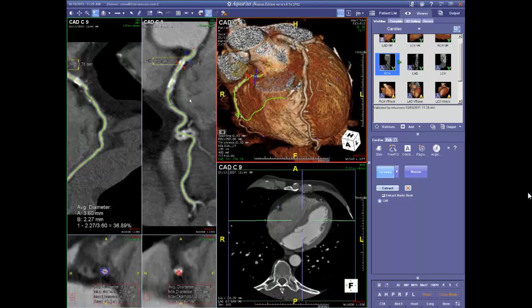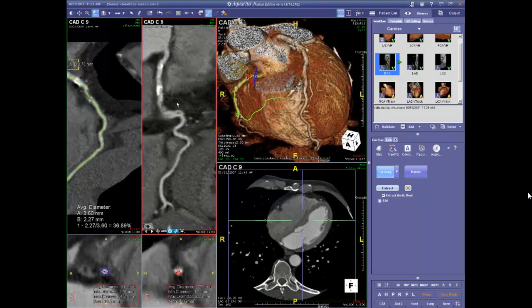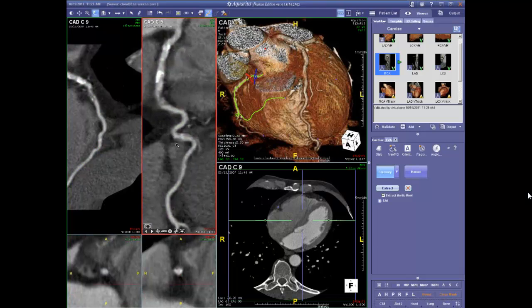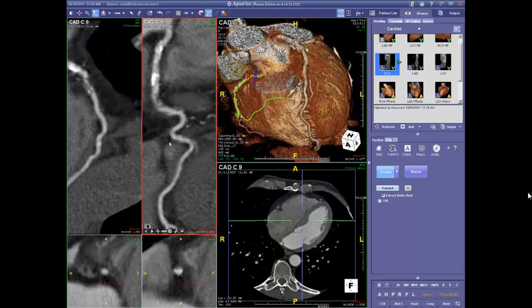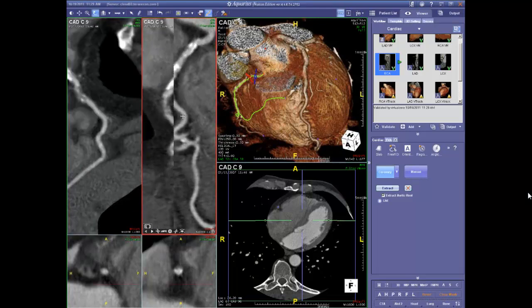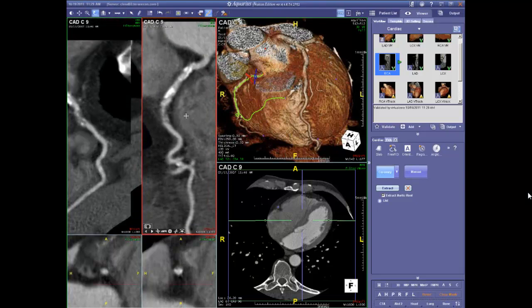And let's just go ahead and use these curved planar reformations. They're very useful. They've been done nicely. And I think the difficulty here, and again, I'll turn off these little mask and assistance overlays so we can just look directly at the vessel, and I'll magnify that up a little bit. And this is, again, a very badly diseased vessel. I can see plaque, and maybe this is as good a view as any. There's a lot of calcium here.